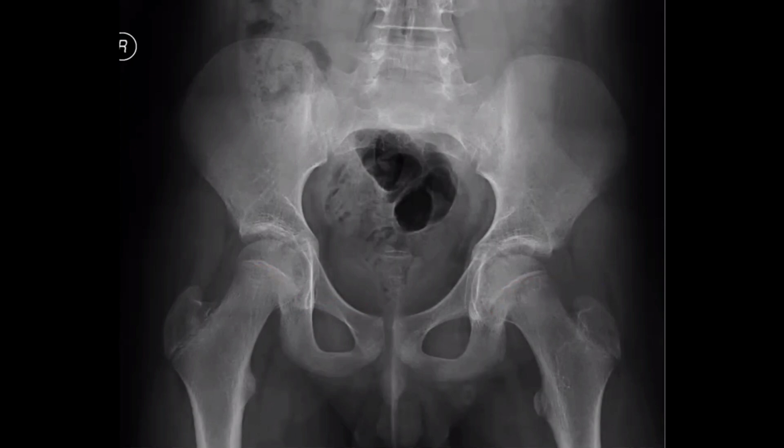I would like to have a probe. How can we confirm? Yes, go on. Yes, sir. First of all, there is a line called Klein's line that we draw. This is a normal line along the superior aspect of the femoral neck. Exactly. It should intersect the femoral head. If we draw this on the left side, I think it doesn't intersect the femoral head, because it's slipped posteromedially.